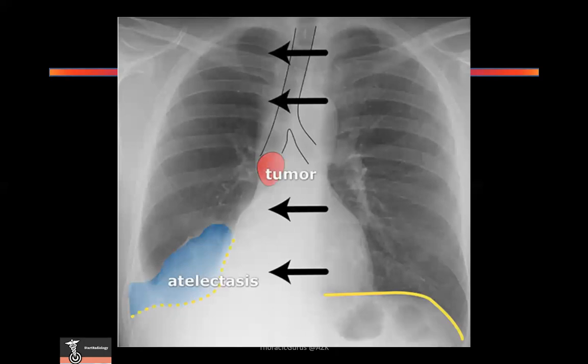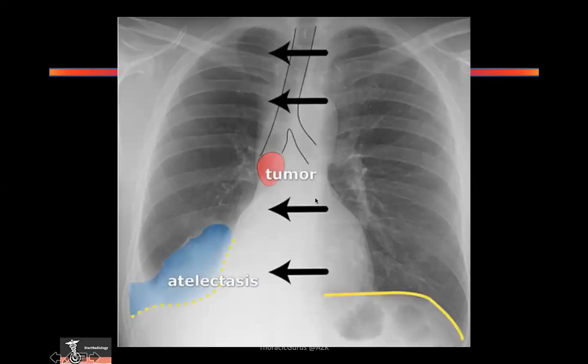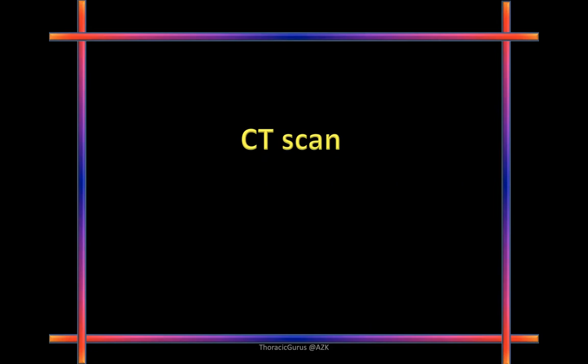But the beauty is if you can see it before I tell you, because very clearly you can see there's something going on here. And if you follow the system of looking at an X-ray, there is a definite cutoff, there is a shadow seen here, an opacity seen here, okay? And the mediastinum is moved to the right, and the left side, there's blunting of the diaphragm. Okay, all right. So these are the basics of a chest X-ray. Did it make sense? Yes, sir.